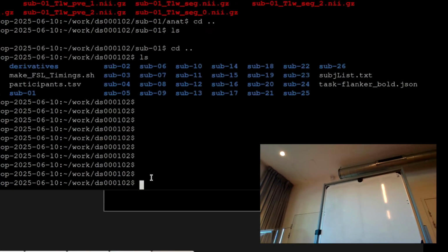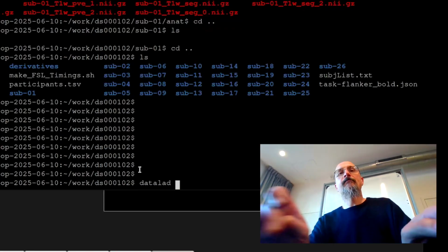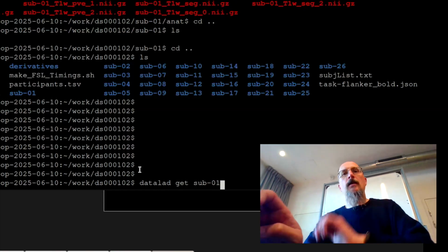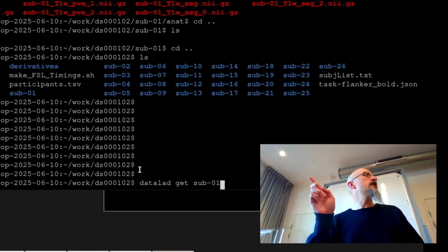What I do is I type datalad get sub-01. Okay. So it will start, you will see that it's starting to download the data for this subject only.